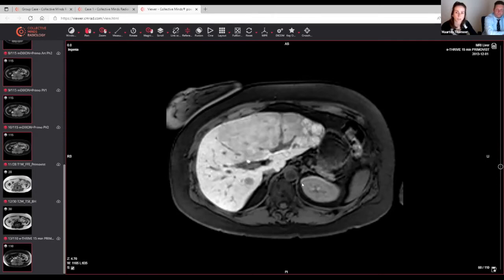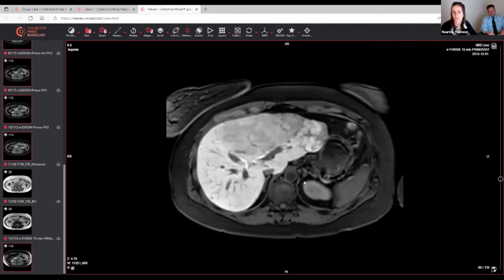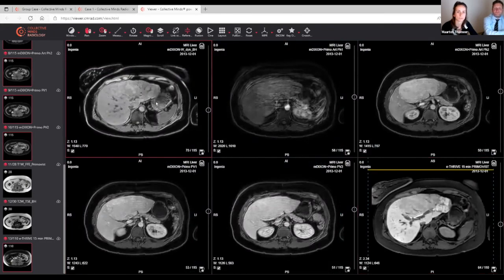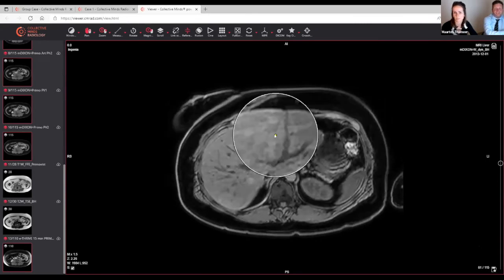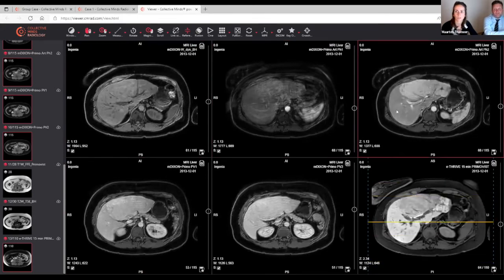Okay. And then I noticed this other lesion. What's that right lesion next to the adenoma? Yes, well, it has a different appearance, I think. I don't think it's the same as all the other lesions we saw. But maybe it's best to start with the dynamic sequences again. So on T1 before contrast administration, it's iso-intense compared to the liver, I guess, with a more hypo-intense center. Yes. And if it's iso-intense, what's the differential? If it's iso-intense compared to the liver, it can be FNH, adenoma, or HCC.